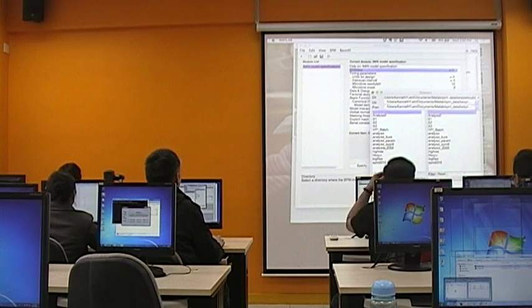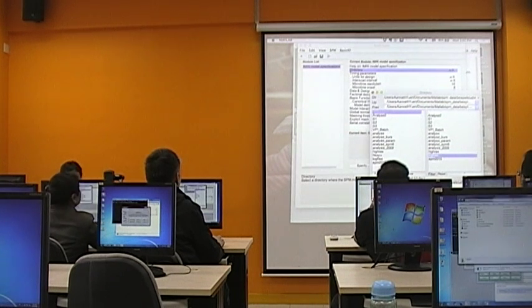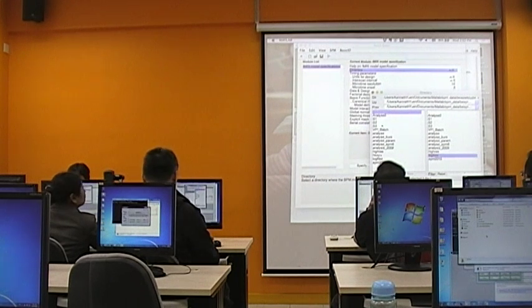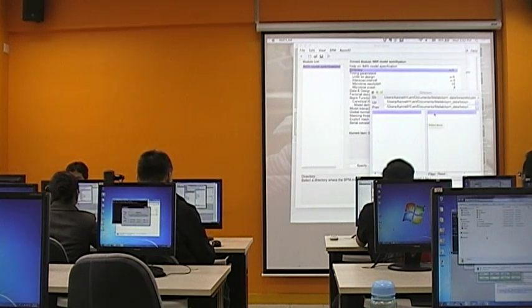When you decide to choose it, you could just simply click here, and you see I selected one directory. If you accidentally, for example on the left hand side, just click into HKSYU, you haven't selected it yet. So what you need to do is click the one dot.